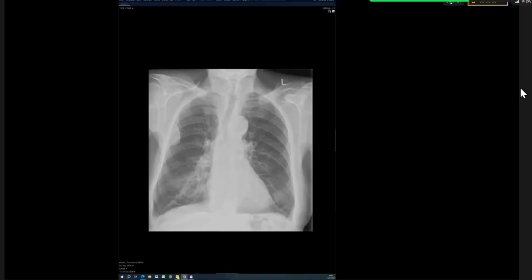On this last case, why could this not be a pleural met with rib destruction? It absolutely can be. And if I was the candidate, I would have said pleural met with rib destruction or a bone met, vice versa. It definitely can be. You cannot differentiate purely on X-ray. But the take-home message should be that if you see that on a chest X-ray, you have to pick the bone destruction and you have to call it cancer. You have to escalate appropriately, considering the patient likely has cancer, either primary or metastatic. So it doesn't matter whether you call it pleural or bone. You can't differentiate on X-ray.